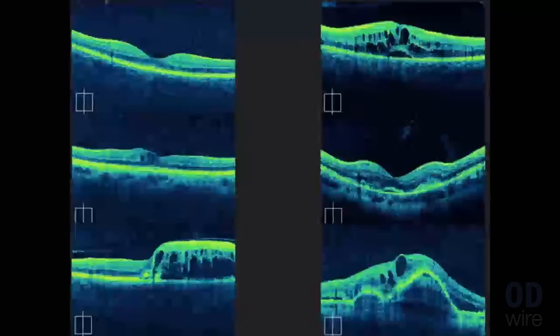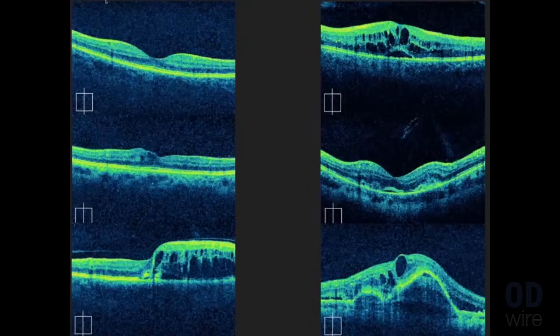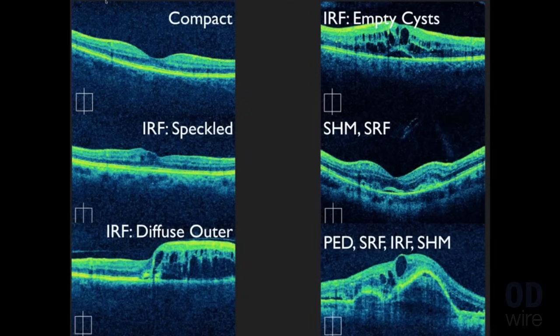What do I mean? Well, let's look at these 6 examples. In these 6 examples, you see that they all look very different. You might not, at a very quick first glance, have the words to be able to describe each of these 6 images. But yet all of these images look very, very different. Let me help you out here by giving you the words to begin to describe these images. Here are the words that we often use.